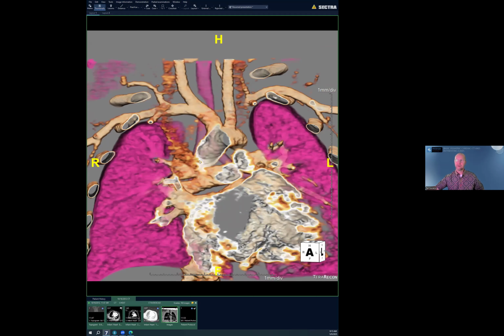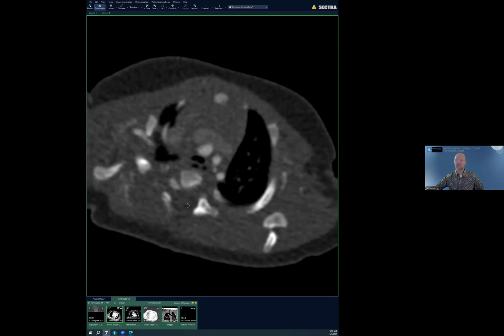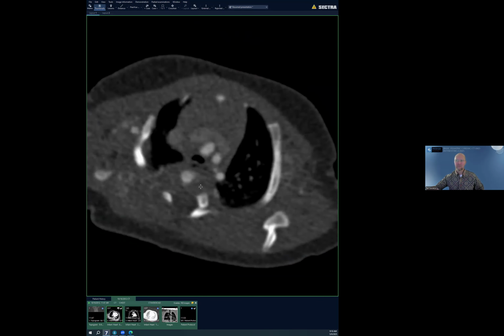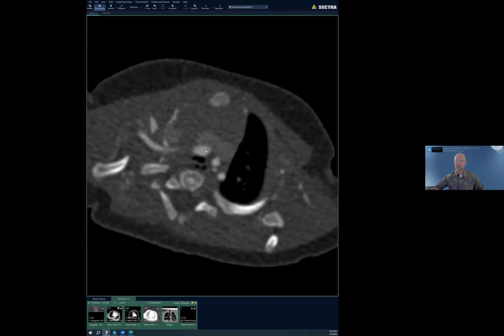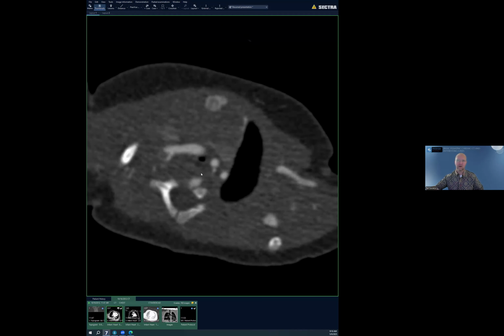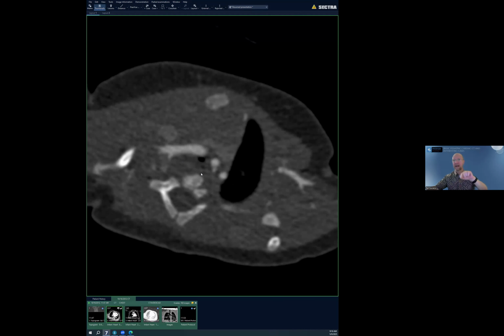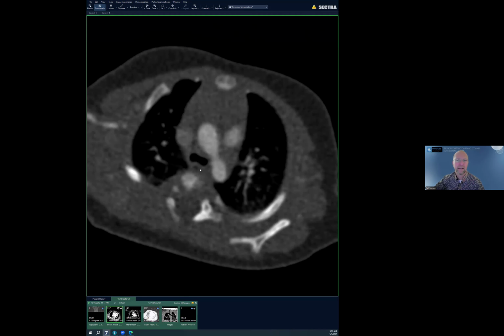So this can be helped, but like Dr. Amal mentioned it earlier, extremely important to look at the trachea morphology as much as we can tell to see how likely it is that the surgeons removing the vascular ring or vascular compression will actually help the child. There's another thing that they can do, obviously, with bronchoscopy. They can look inside the airways and examine the morphology of the trachea, the completeness or the C shape of the cartilaginous rings. So that's the next case I had.